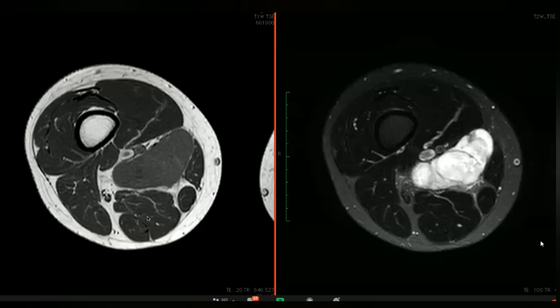at least tell them where to biopsy from, because the surgeon will then tell you, okay, I'm going to operate from this aspect, or I'm going to approach it from this aspect. You're absolutely right. If the surgeon doesn't tell you where to go, then you are better off approaching it from the medial aspect, even avoiding the muscle, because the surgeon may be able to cut up this area.